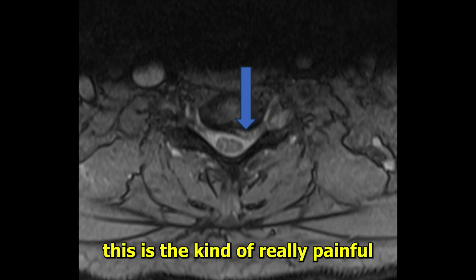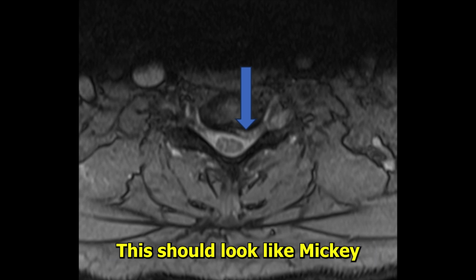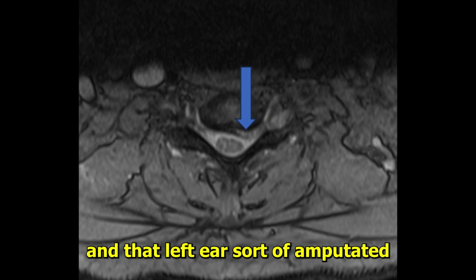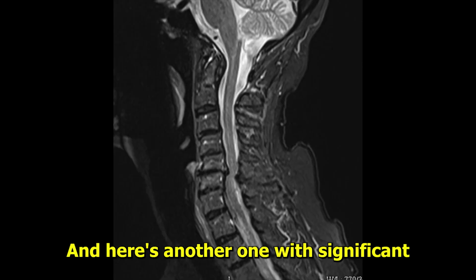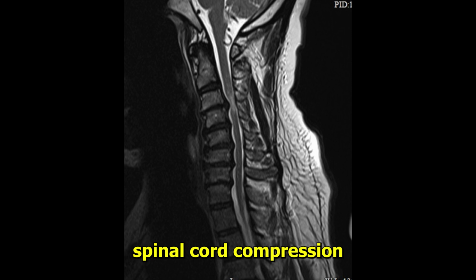And this is the kind that are really painful where the blue areas, that's a disc herniation laterally. This should look like Mickey Mouse. See his face and his ears, and that left ear is sort of amputated. And then here's another one with significant cervical spondylitic changes, significant degenerative disc disease. But at C5-6, you got severe spinal cord compression.